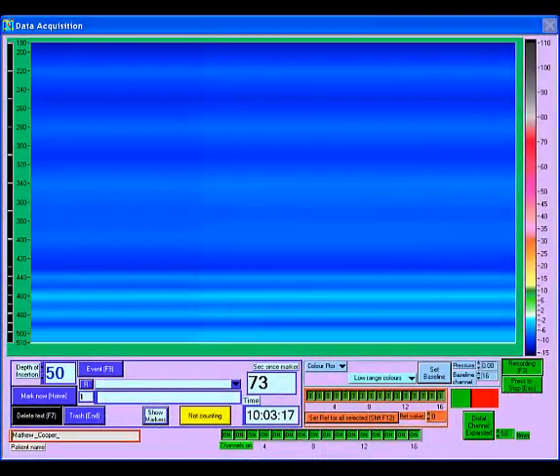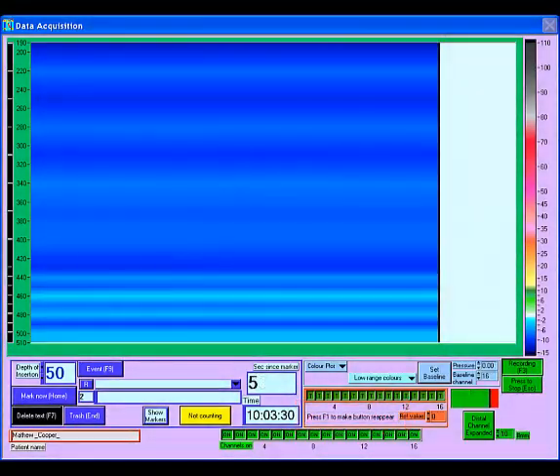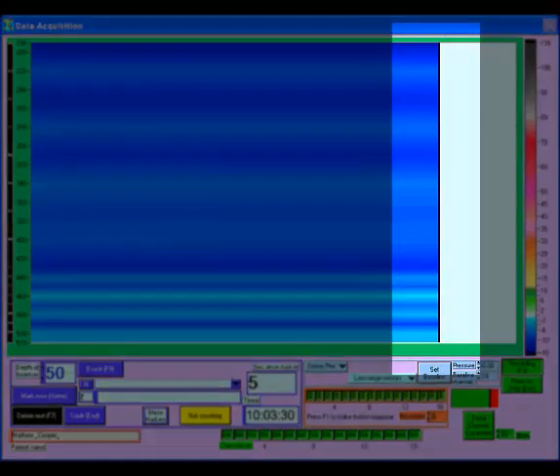Clicking on Set Ref for all selected will set the current pressures in the selected channels, all are selected by default, to 0 mm of mercury, which will now be recorded as atmospheric pressure at that level. A marker will be inserted in the recording, indicated by a vertical black line on the display.